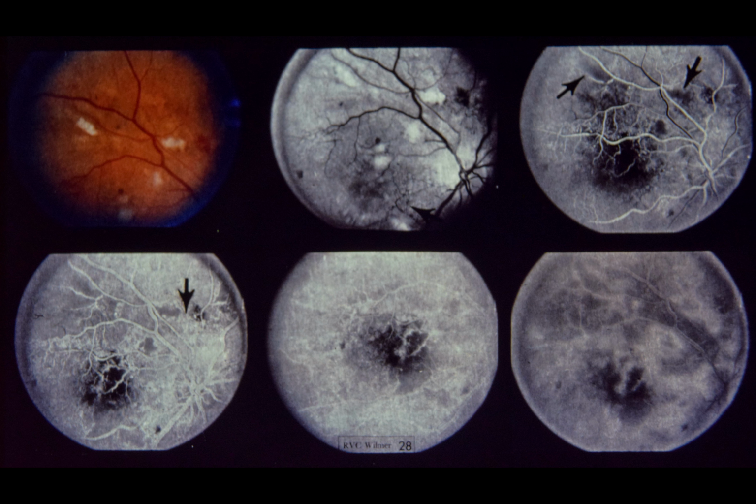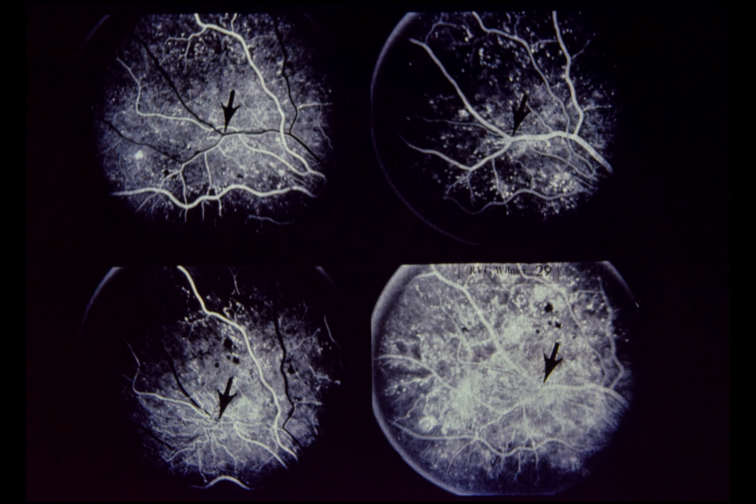This 19-year-old white female with a 7-year history of diabetes had visual acuity of 20/20. All photographs are of the superior temporal fundus, right eye. The photographs above are from July 1974, and photographs below are from January 1975. For orientation, arrows point to same AV crossing in all 4 photographs.